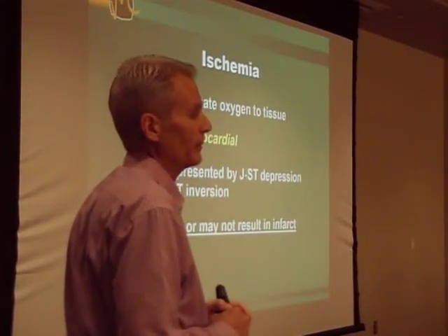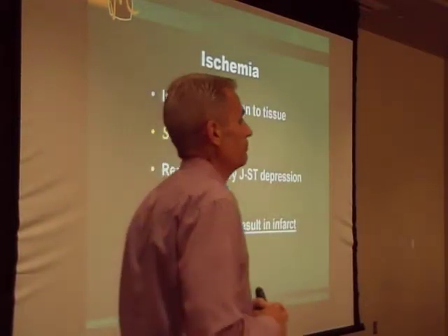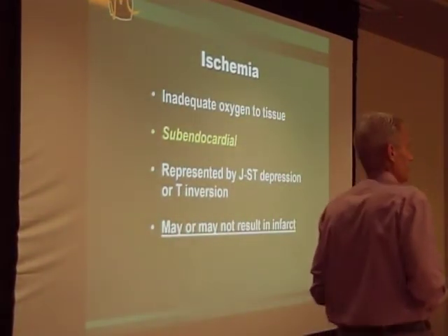They're on their way. Really, it's just ischemia, correct? Pardon me? It's just ischemia, that area is ischemia. Correct. That's what we're seeing.